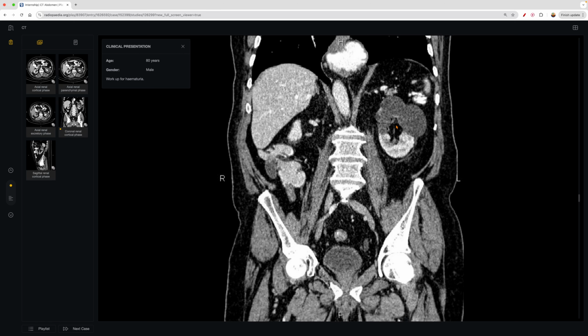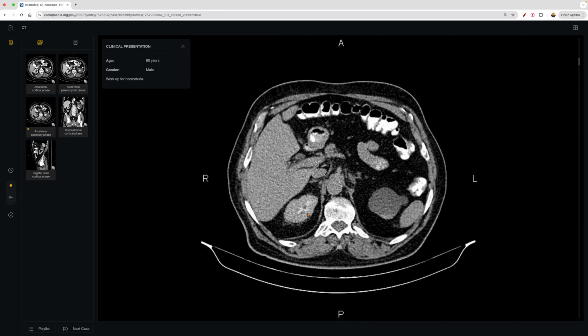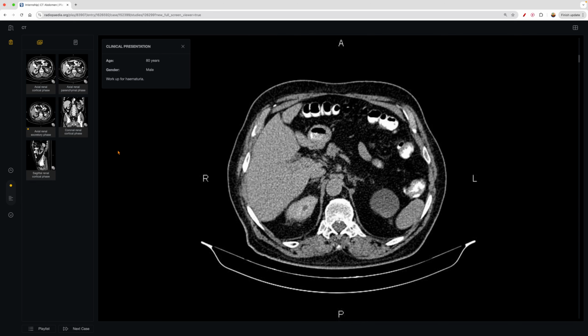And then in contrary to the other case that we saw of the kidney stone, very, rather mild, we'll say, just in terms of the lack of obstruction, right? And so you can see here, and this looks like the contrast, and that's why, again, it can be a little difficult when you order contrast for kidney stones.